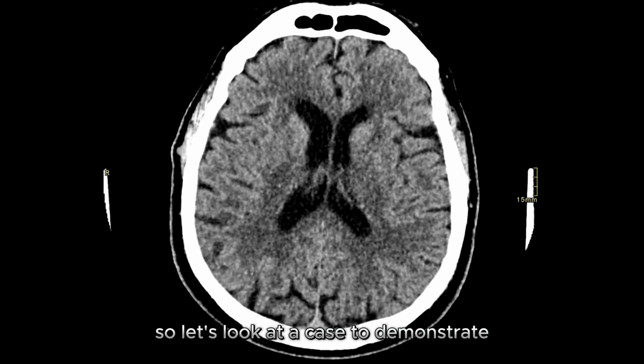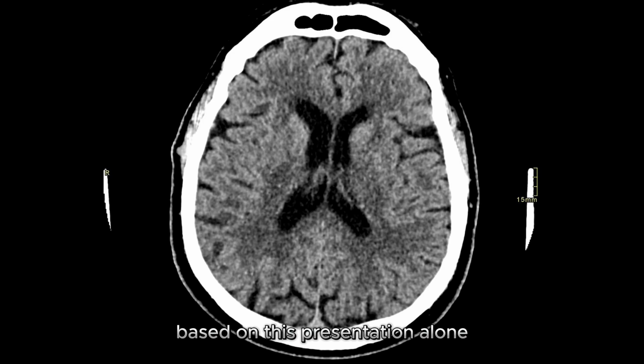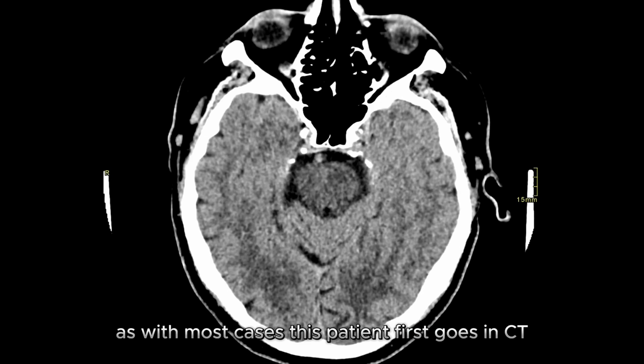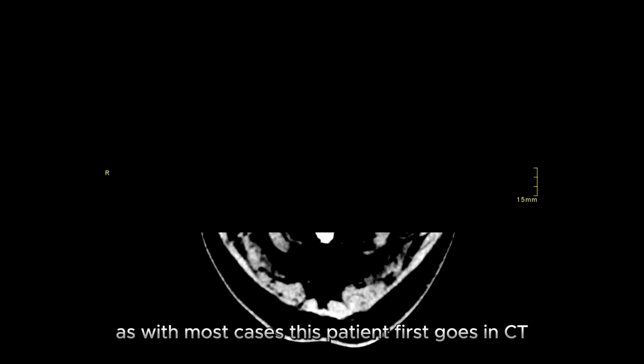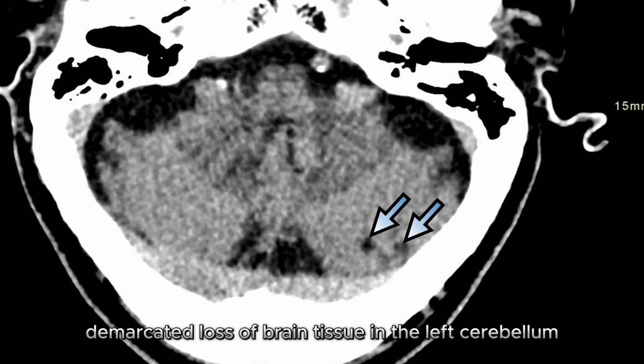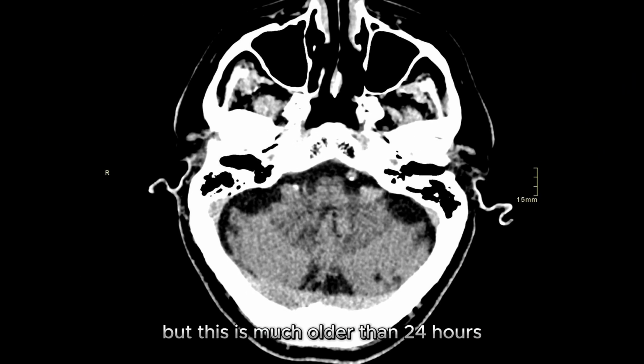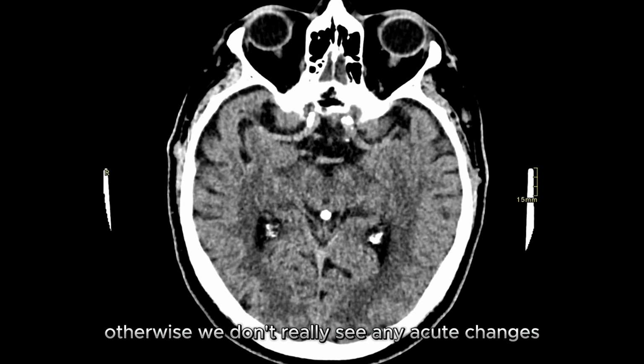So let's look at a case to demonstrate. Here we have a patient presenting with dysarthria and ataxia roughly 1 day after onset. Based on this presentation alone, we might expect a posterior circulation stroke. As with most cases, this patient first goes on CT. On the non-enhanced CT, we see a well-demarcated loss of brain tissue in the left cerebellum, which could be from a previous infarction. But this is much older than 24 hours. Otherwise, we don't really see any acute changes.